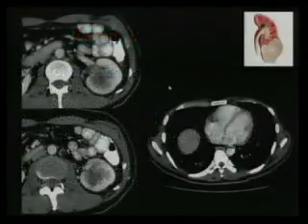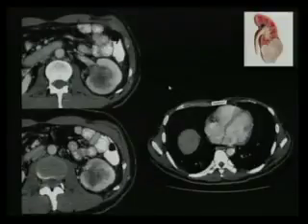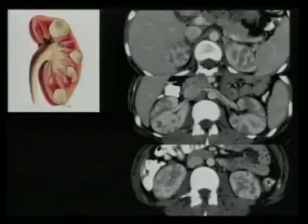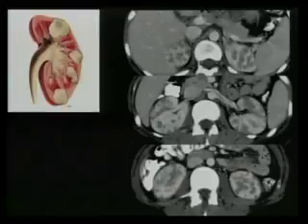Let's see the one that is a solitary mass. Usually renal lymphomas are hypovascular lesions. The margins are not well defined, like in this case in the left kidney. These are also well defined but multiple. Look at the pattern of the lesion, low density, bilateral. Differentials can be metastasis.